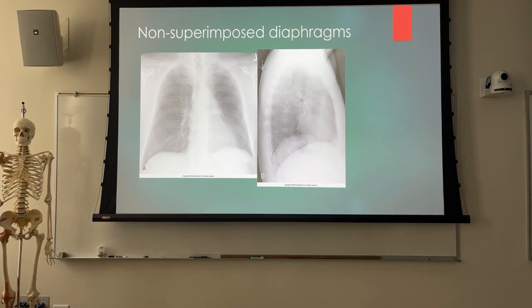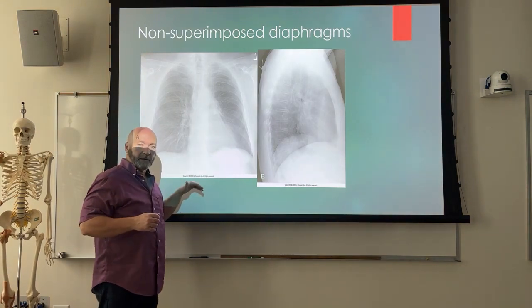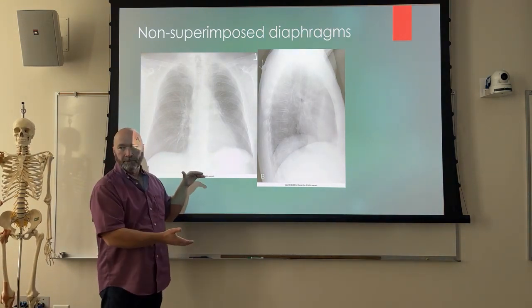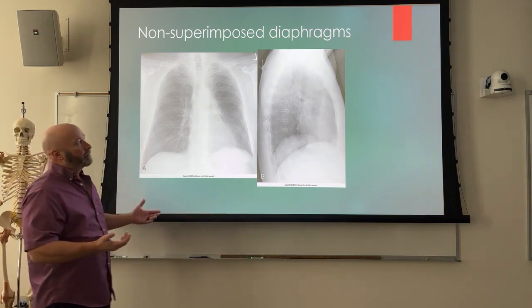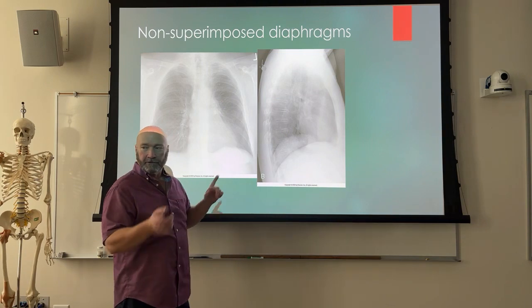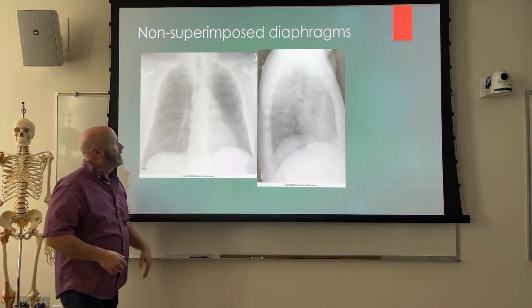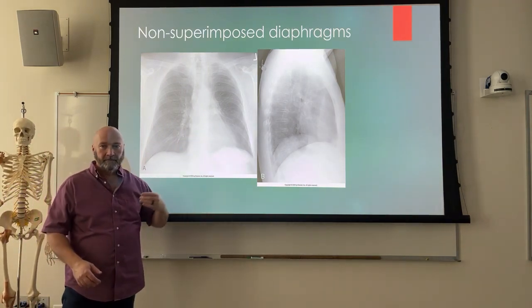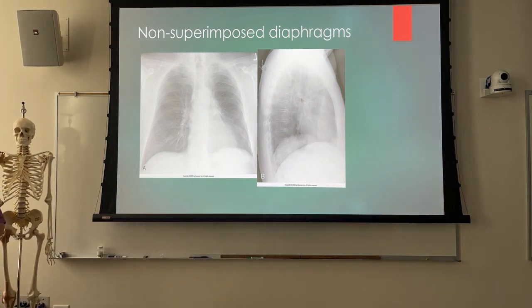So you do a left lateral on the patient, and the highest diaphragm is closest to the image receptor. The right diaphragm is going to be projected further inferiorly. Okay? So again, before you assess the patient to determine if they're tilted, if you see vertical separation of the diaphragms, take a look at your PA. What could cause the left diaphragm to be elevated? We talked about it last week. Two things, really. Edema, or no, emphysema. Emphysema is going to really extend both of them. They're going to be flat.